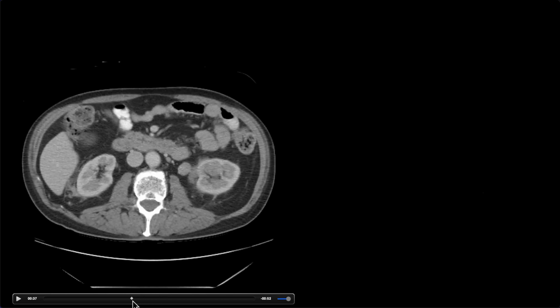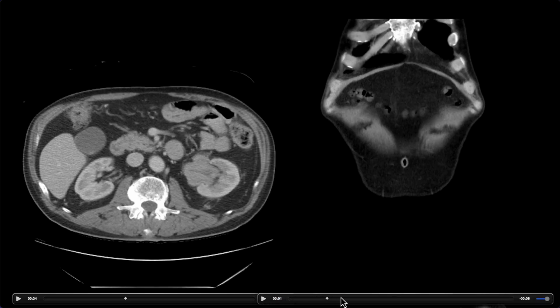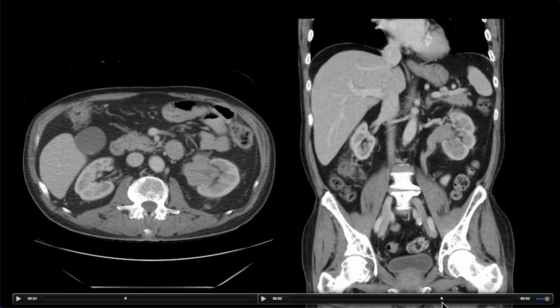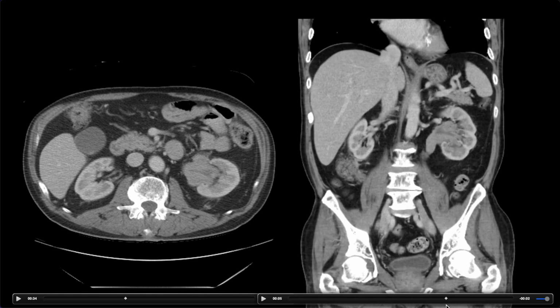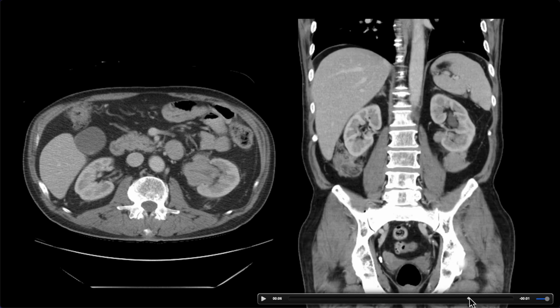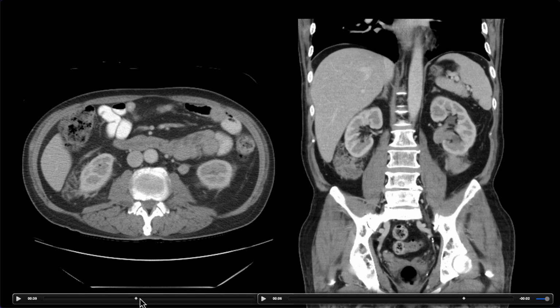All right, so here's our lay of the land. This left kidney has this strange looking soft tissue infiltration of the renal pelvis, which maybe at first glance you're thinking, wow, that looks like urothelial carcinoma. Well, we can expand our differential a little bit beyond it, because now we're dealing with not only this mass, but we have these strandy soft tissue masses in the retroperitoneum as well below the kidneys.